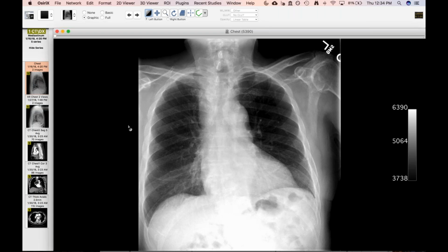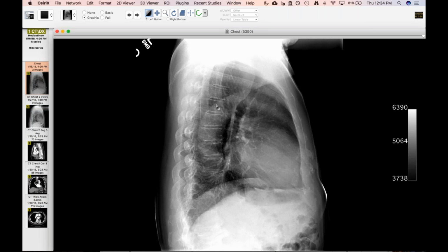This is another. I've got a couple of quick radiograph cases, just some nice subtle radiograph findings that, if you know where to look, you can make the diagnosis. This one kind of reminded me at first of your aortic case that you showed. And you can see in this case that there's a big right paratracheal abnormality. And sometimes you just have tortuous vessels or increased mediastinal fat. There may be a little bit of mass effect on the trachea.